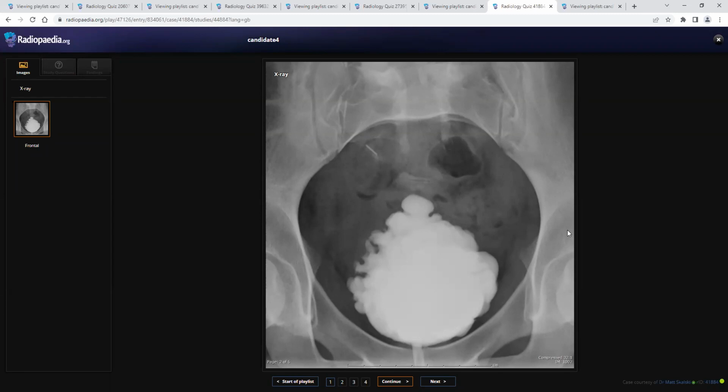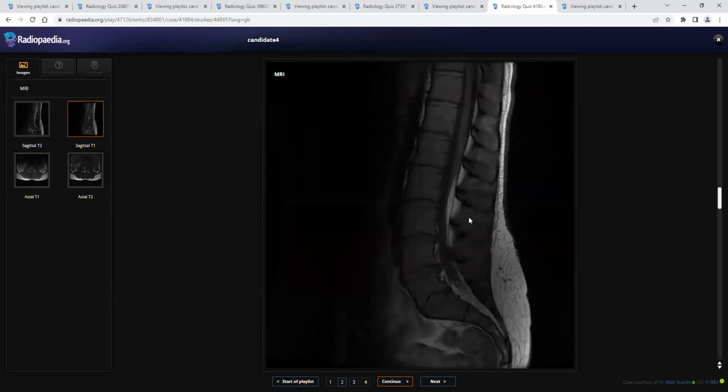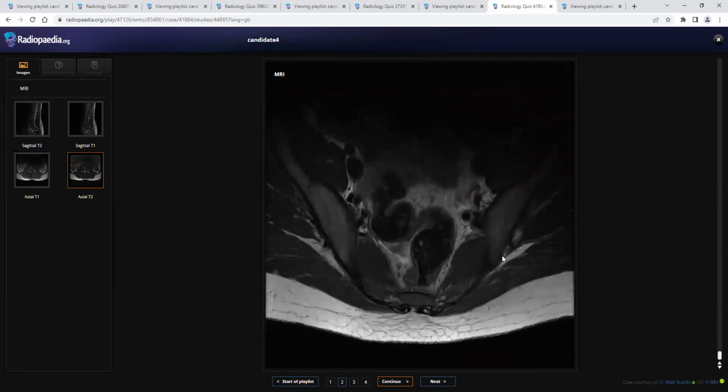Similarly, this is the micturating cystourethrogram showing Christmas tree appearance and the neurogenic bladder. You told sacrum is absent, but there is a defect in the posterior elements of the sacrum. So spina bifida occulta of the sacrum. Then they evaluated with MRI lumbosacral spine. And as you told, there is a low-lying conus, not at the level of L2 or L3, with thickening of the filum and also fatty deposit. Can you see this? The T1 weighted fatty filar lipoma with low-lying cord and thickening filum. So that's how the patient had neurogenic bladder, and there is no lipomyelomeningocele.